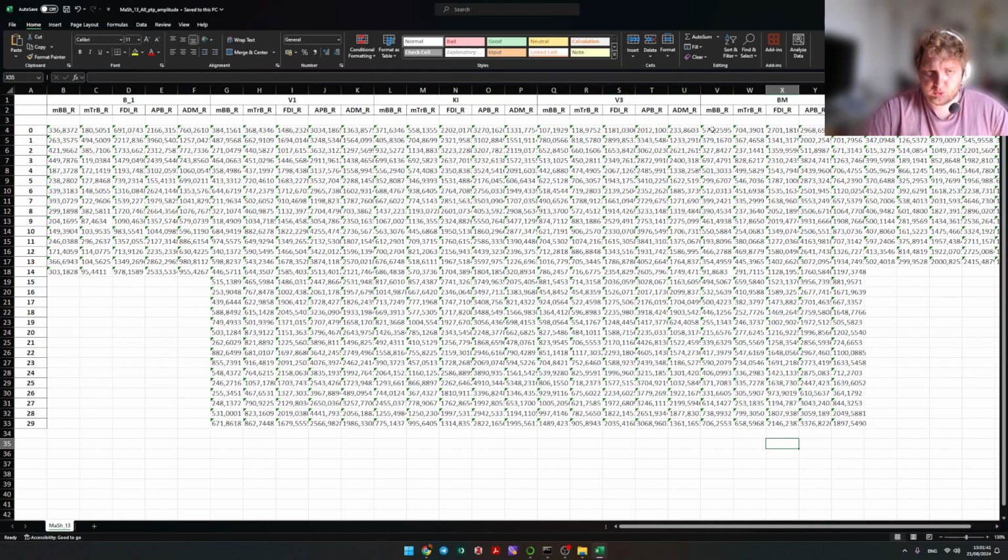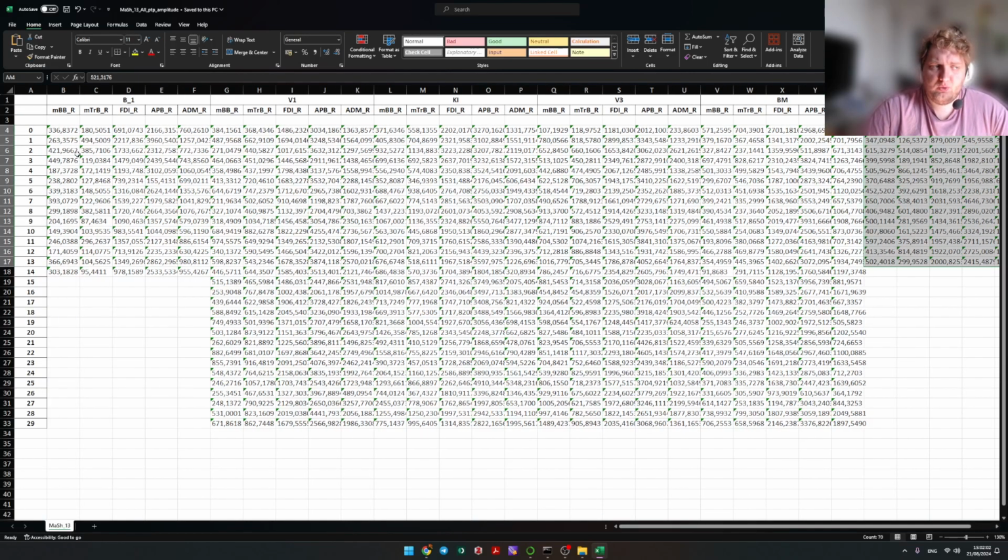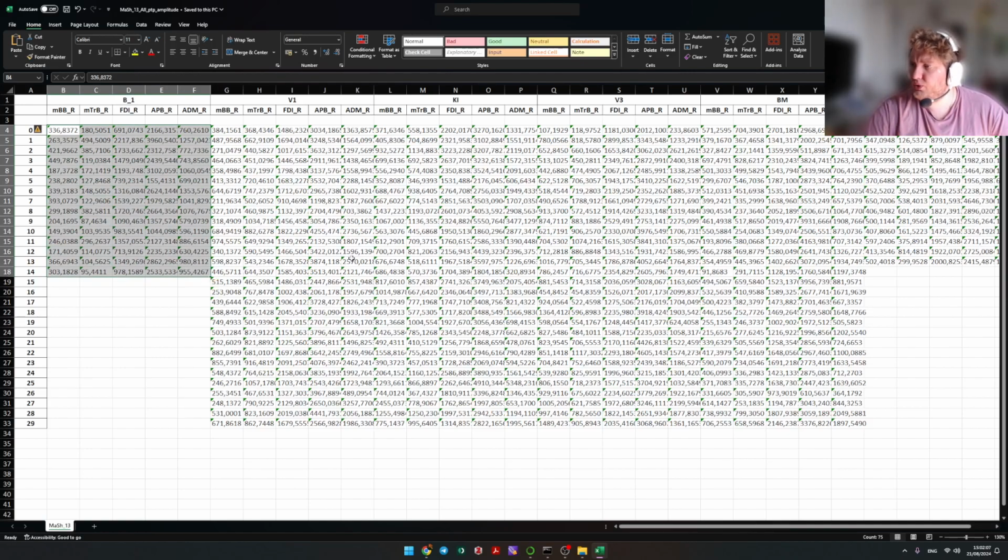Maybe it wouldn't work so well in case of dirty raw files, for example. But this is another problem, and nobody could count on this, because dirty raw files and corrupted data aren't something good. We need to avoid it in any case. So you got it. And for now, you could use our manual analysis, that tutorial that I recorded for you before, and you could just proceed with the same Excel file. Whatever you like, but still collect this data.